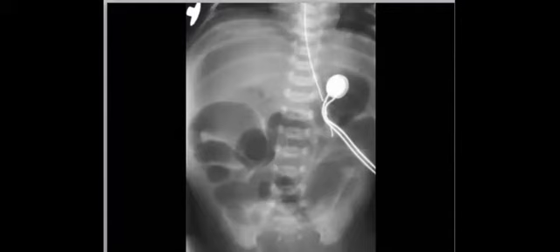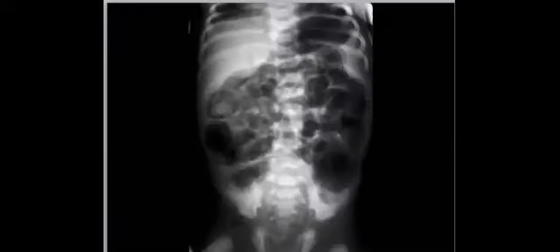It can be idiopathic. Your type of patient will be premature or mature, term or preterm. Premature. So the most important thing is to mention that it's premature. Dilatation of the bowel loops, okay. Search for the portal venous gas, the most important thing to know. This one, when you find it, you can describe it, try to describe.